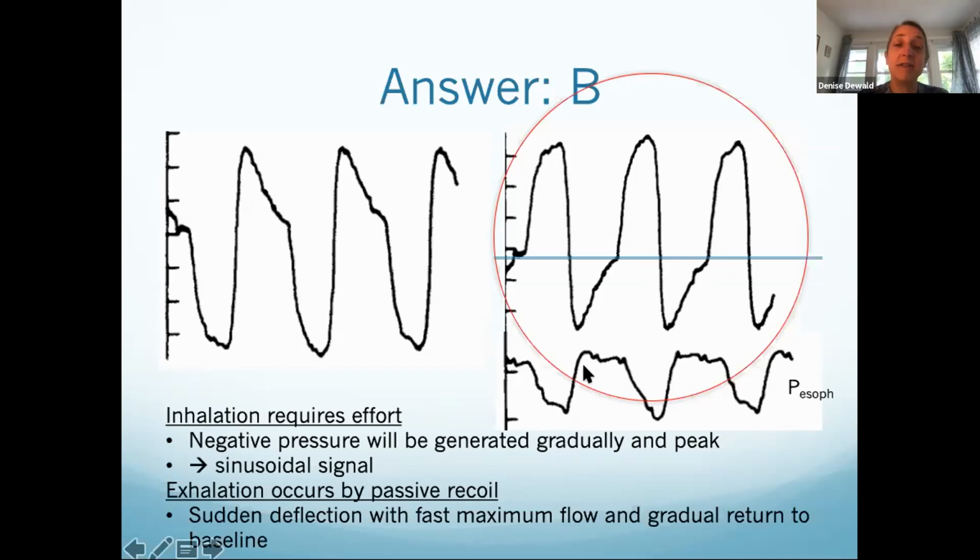Oh yeah. So this is the easy way to know whether you have inhalation and exhalation. And so this is like in a research setting. Stanford used to do this, but they stopped doing this. But the esophageal pressure, you put your little pressure transducer down the throat. And so it's monitoring the pressure transmitted into the thorax. And so it becomes more negative when you inhale, and then it goes positive when you exhale. And so this way you can very clearly determine, okay, this is inhalation, and then this is exhalation. Inhalation, exhalation. Guys get that?